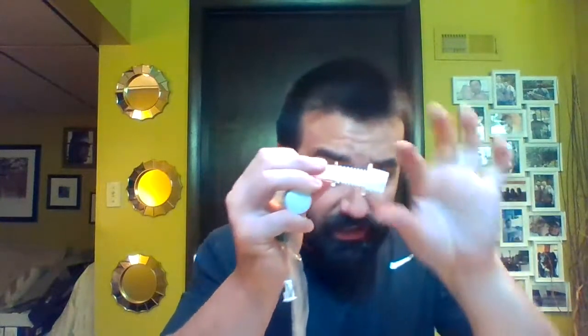So the Omniflex adapter, the accordion adapter, takes torque off your airway, and should be used for all your tracheostomy patients who are requiring ventilation. We'll talk more about that inline suction catheter here in just a little bit.